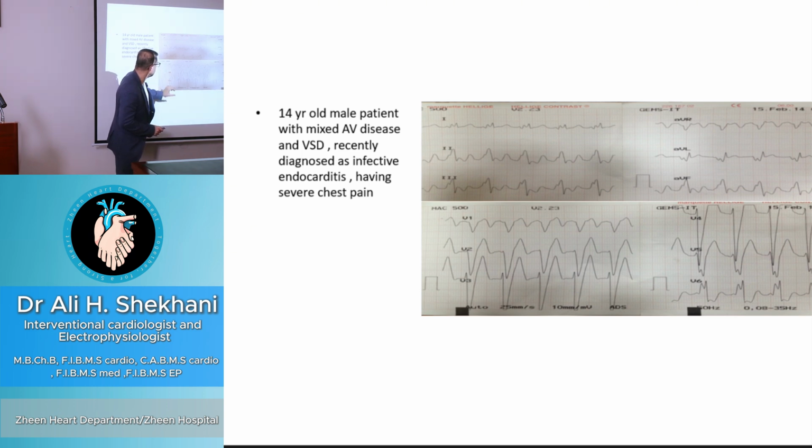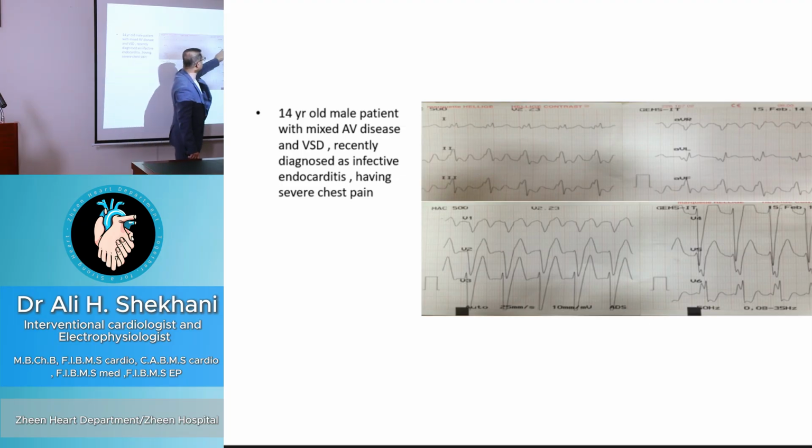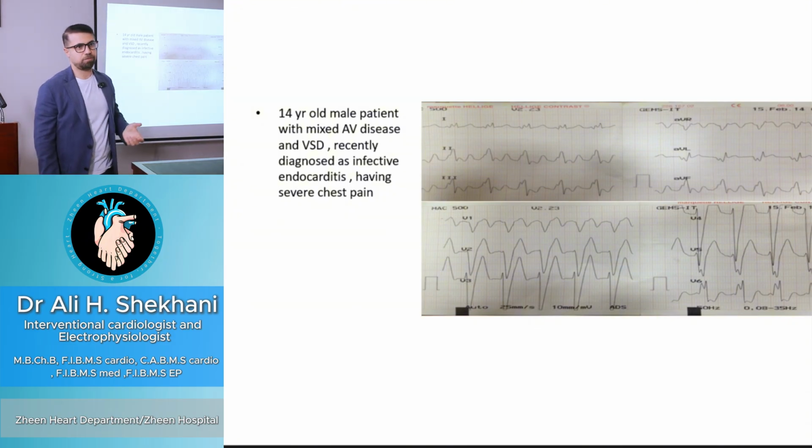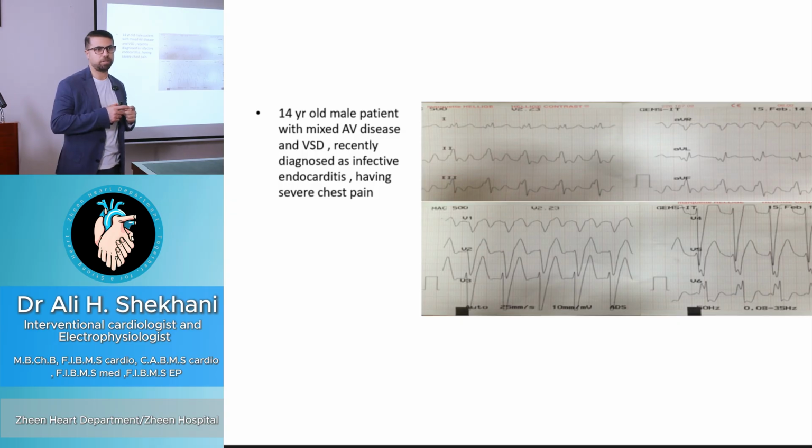If we come back to our patient, you can appreciate there is more than 5 millimeter ST segment elevation in the discordant lead, and also there is ST elevation in the concordant lead, more than 1 millimeter. And unfortunately, the patient suffered from acute myocardial infarction secondary to vegetation in the aortic valve.